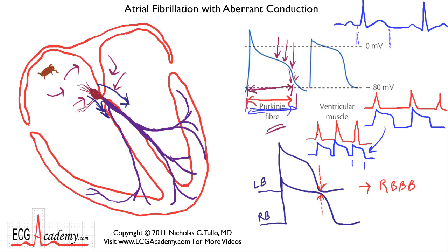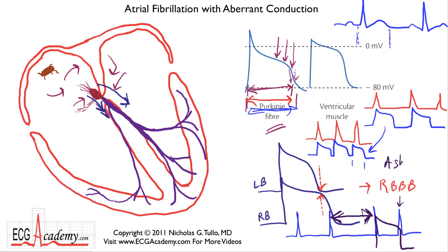But what happens is this action potential duration changes from one beat to the next. And you see that especially with atrial fibrillation, so that if you have a couple of long intervals and then a short interval, this long R to R interval right here results in this beat having a relatively long action potential. So if another beat comes down quickly, it may encounter refractoriness in one of the bundles. This was described by a guy named Ashman, and it's known as Ashman's phenomenon.